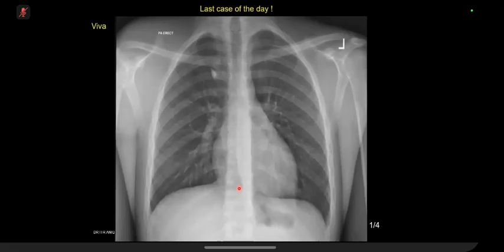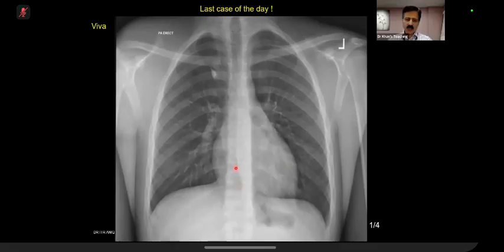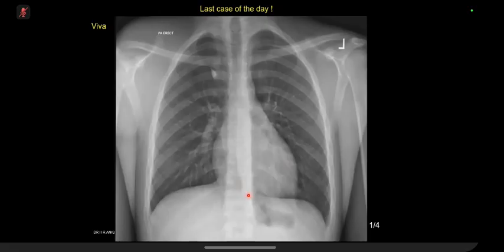So there appears to be increased density in the left paravertebral region behind the heart shadow. This thing, I am not worried. Please continue. So I'm looking at the remainder of the lungs. There's no consolidation or collapse. Incidental note of an azygos fissure. So I'm reviewing the bones.